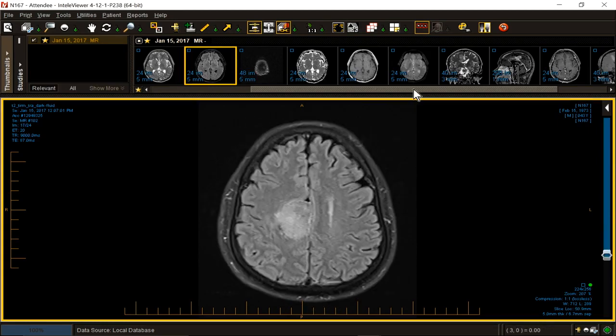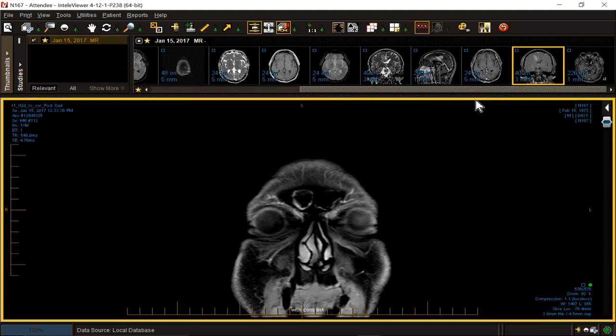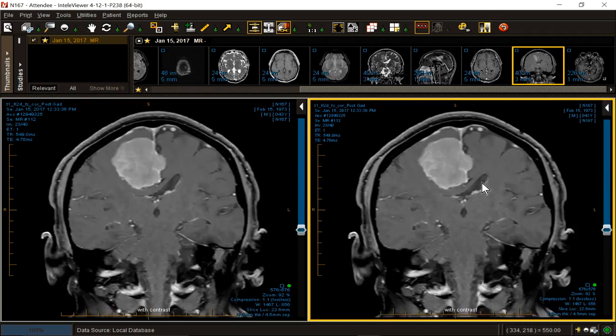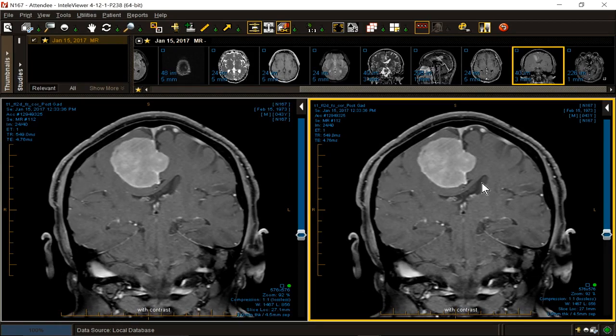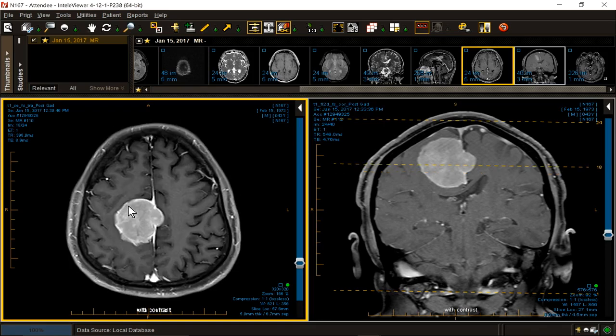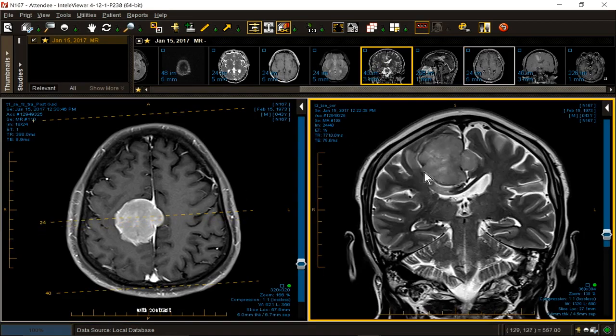And then finally, we come to the lesion at hand, which is perhaps best demonstrated in the coronal projection, and that is an extraaxial mass. Is it intraaxial or extraaxial? Obviously extraaxial. It also demonstrates in the axial projection a little bit of a dural tail. There's our tail. It has a rim or capsular sign due to displacement of vessels, a pseudocapsule of fibrosis, and some dura. The amount of edema should not throw you off that this is a meningioma.